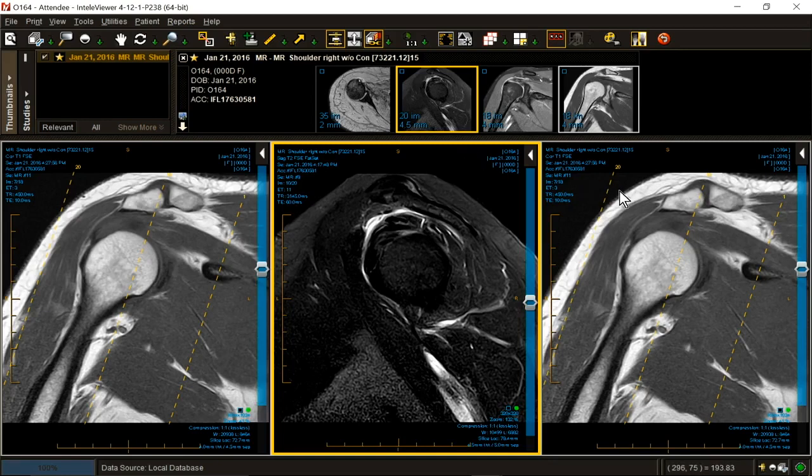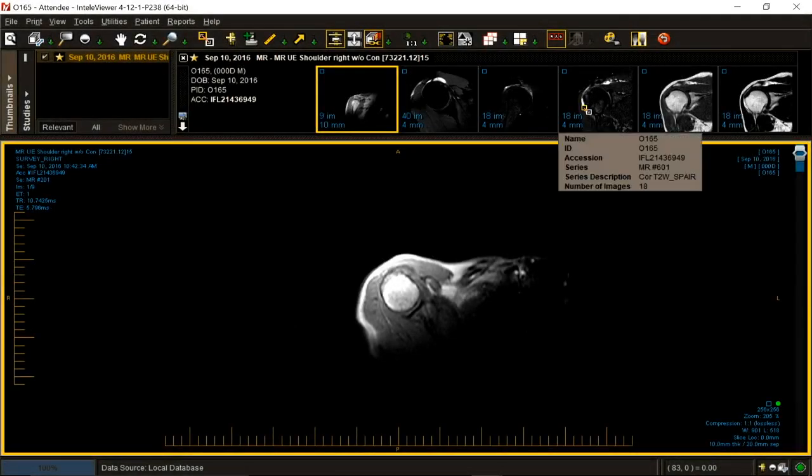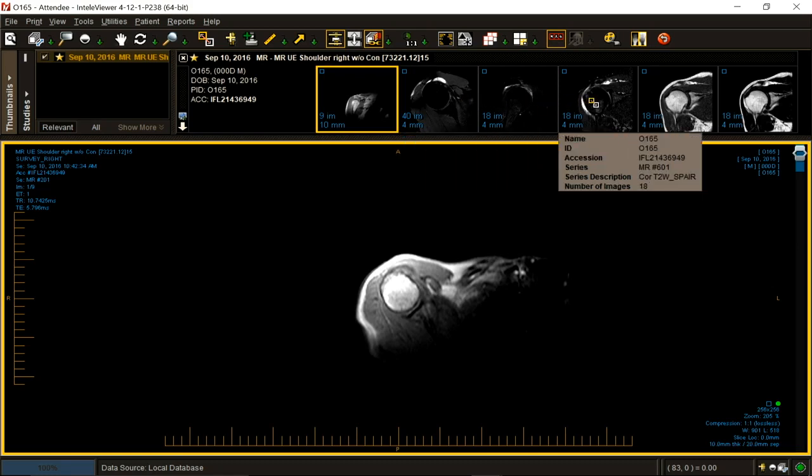Let's do another one, shall we? It's kind of a how I do it case. This is a 55-year-old male complaining of shoulder pain. He had a lifting injury 7 years ago. It sure took him a while to get in, huh? He must be from Canada.